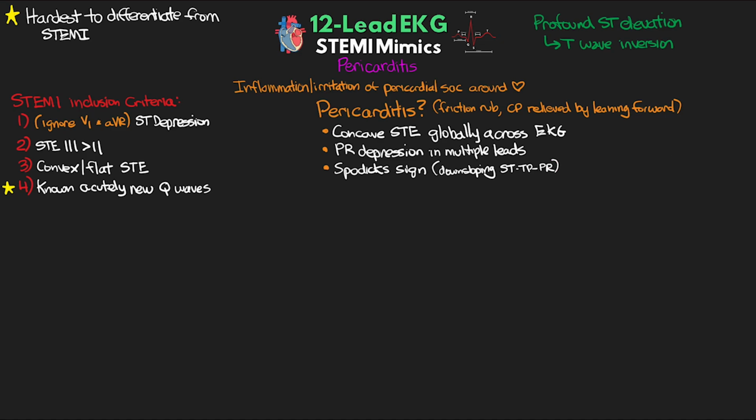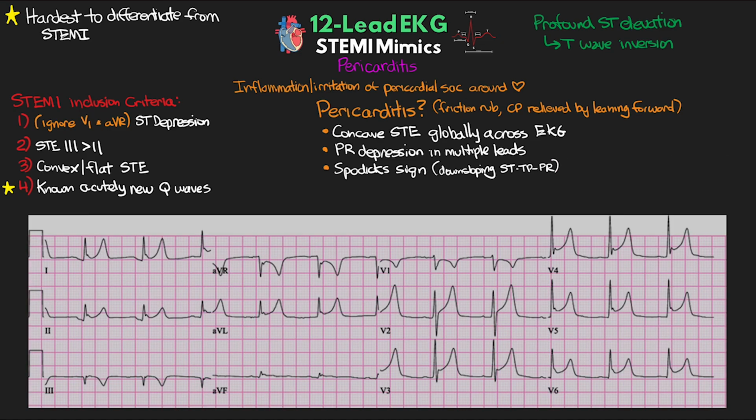All right, so let's take a look at an EKG here. On this EKG, you can see we've got ST elevation all over the place. But before we start considering pericarditis, we need to look for any of those STEMI inclusion criteria.